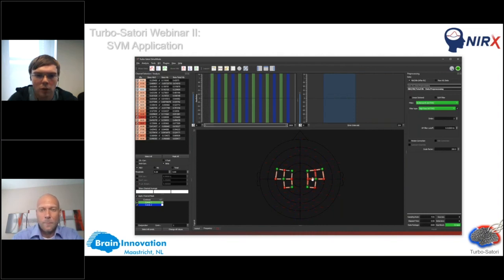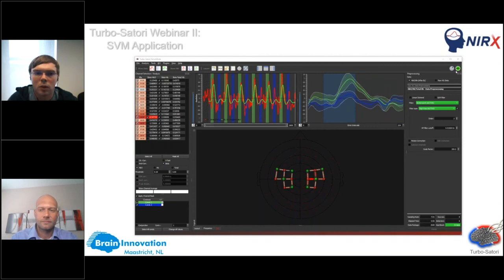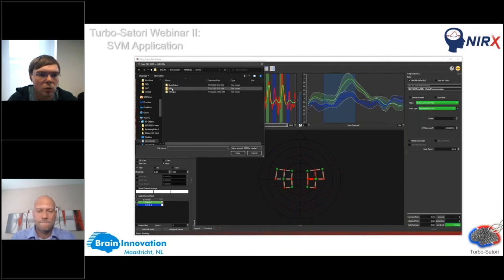If you want to access this information, I can just show it over here. You can see that by showing the predicted, for example, the data demo.